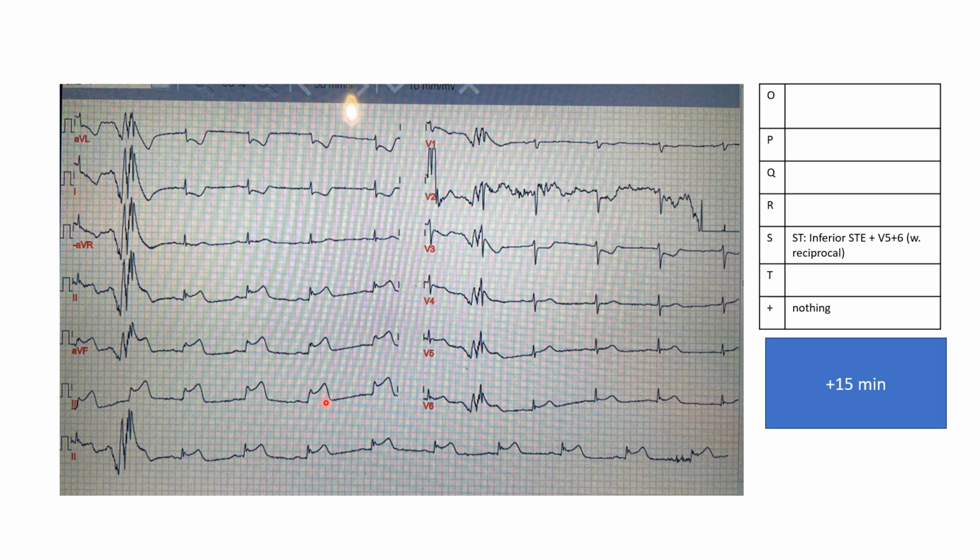So the pretest probability and the history of the patient is always important, even though we see definite ST elevation here. It may be because of something else than just an OMI. It might be a MINOCA, might be something else, but definitely PCI.